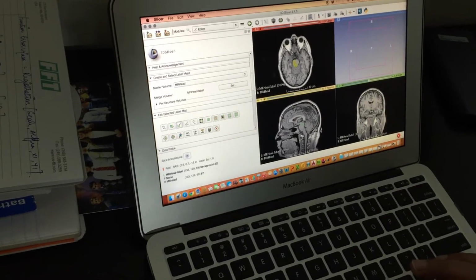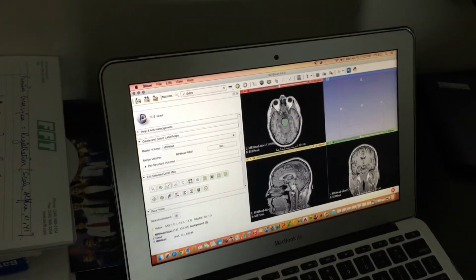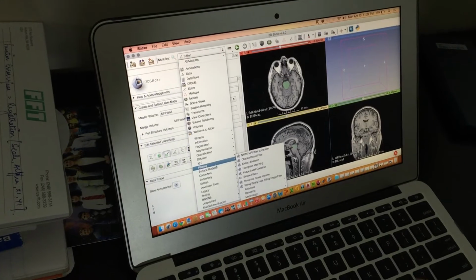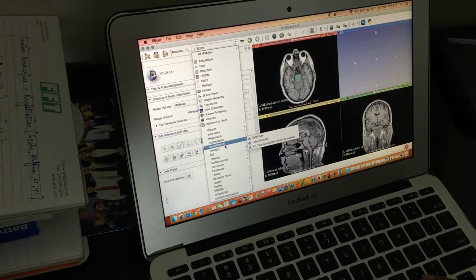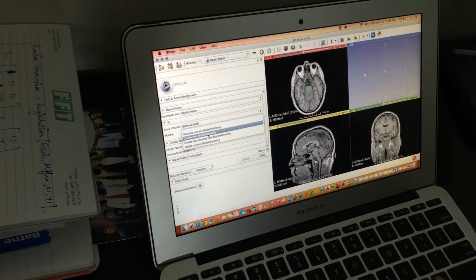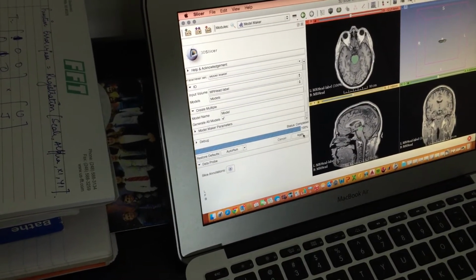I think these are enough slides. So now you can see the area that we have segmented out here too, and even on the back view of the skull. So let's go to surface models, model maker, and then we create a new model hierarchy. Rest everything should be fine. Yes, then we apply the changes, and this is what we get.